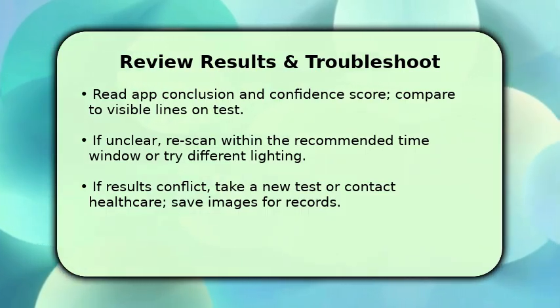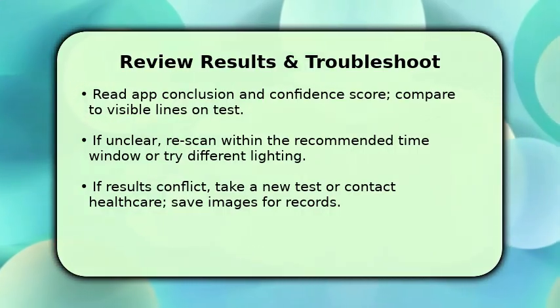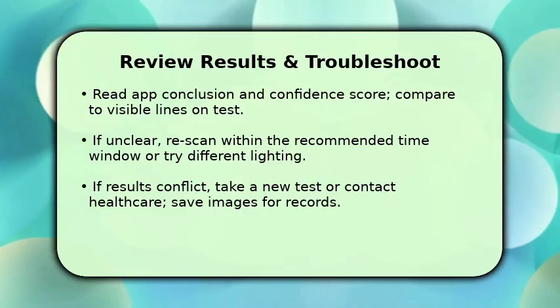If the app disagrees with what you see, take a fresh test or contact your healthcare provider. And make sure to save the images and timestamps for any follow-up.